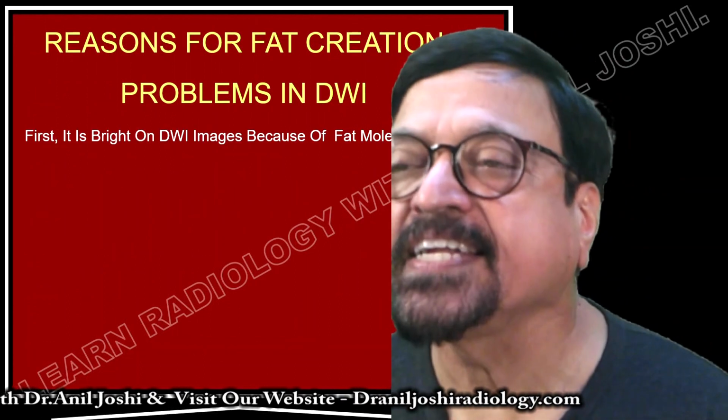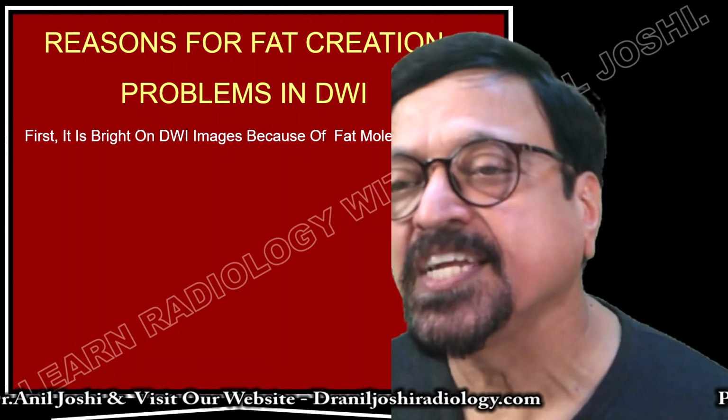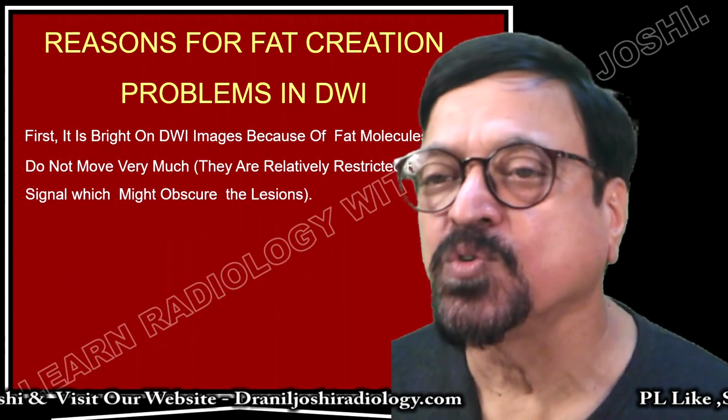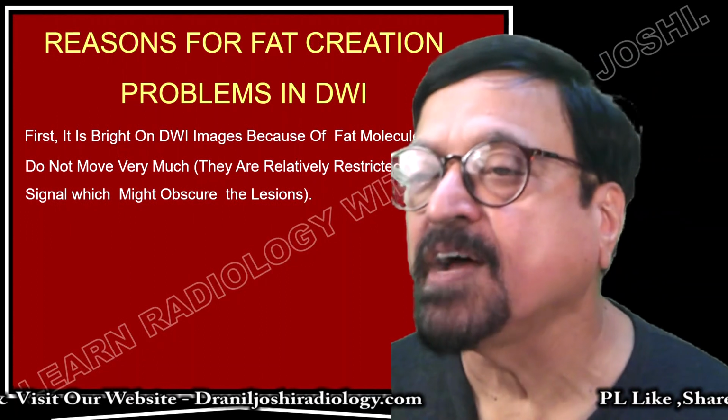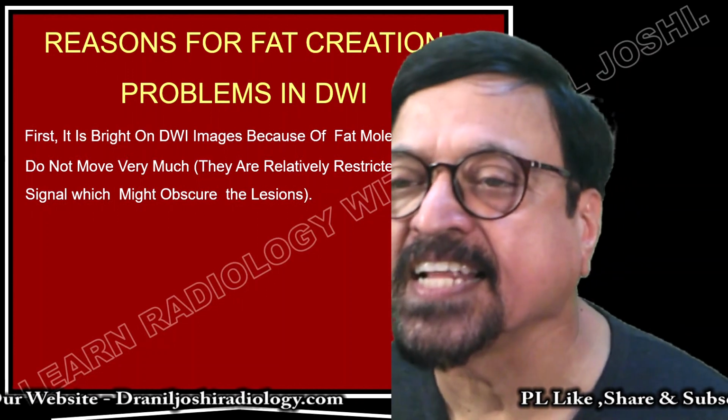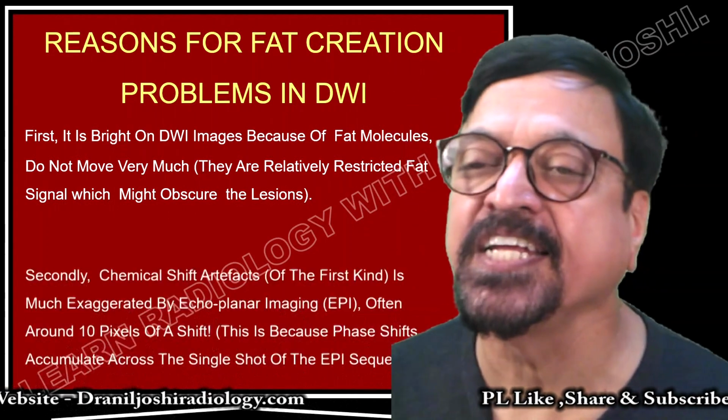Now, reasons for fat creation problems in DWI. First, it is bright on DWI images because the fat molecules do not move very fast. They are relatively restricted fat signals, which might obscure the lesion.